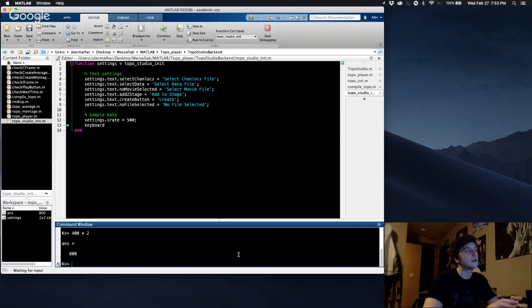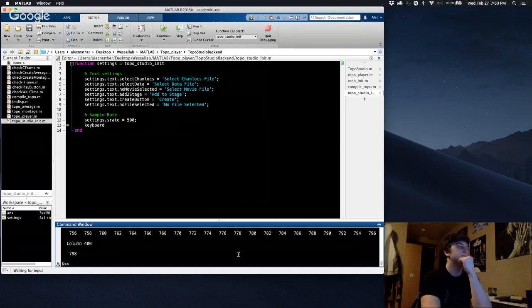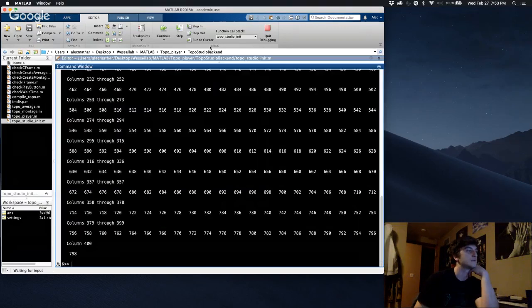And then technically we subtract 1 because we start at time point 0. So time point, so we would do minus, and then we would say from 0 to whatever the answer was by 2s. And these are going to be all of our time points.